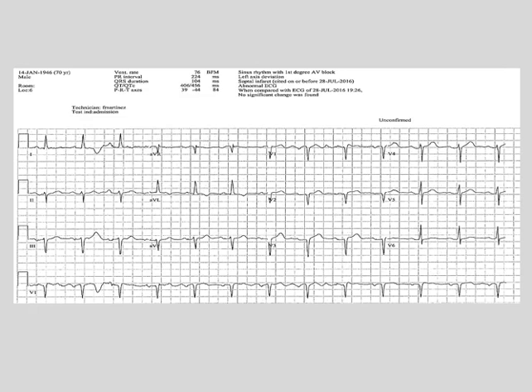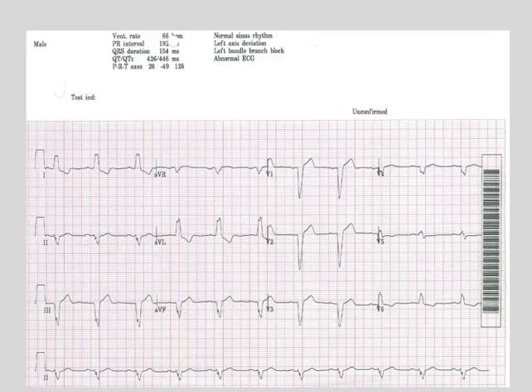Most of the time you will have the patient's history in evaluating these ECGs. Here, we're looking for individual isolated signs just to familiarize you with identifying specific features. So if a patient comes with rip-roaring chest pain and you have only subtle ST elevation, you know it has to be real. But for the moment, let's continue just with individual observations. This is a nice cleaner trace. We haven't been looking at rates so much because you are obviously familiar with how to calculate your rates, but it should be part of your normal examination.